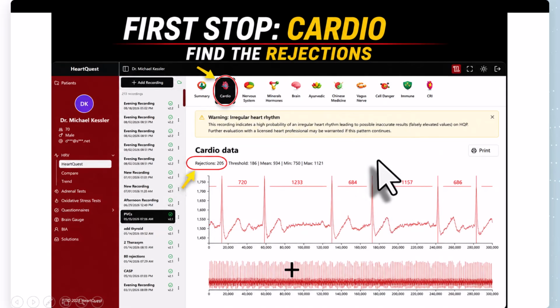And what you're looking for here, I'll go back here. You see where the yellow arrow is and it says rejections? It says 205 rejections. It should not be over 20 rejections. So anything over 20, you're not going to read the test because it's going to make those R to R waves look much, well, let's talk about it.